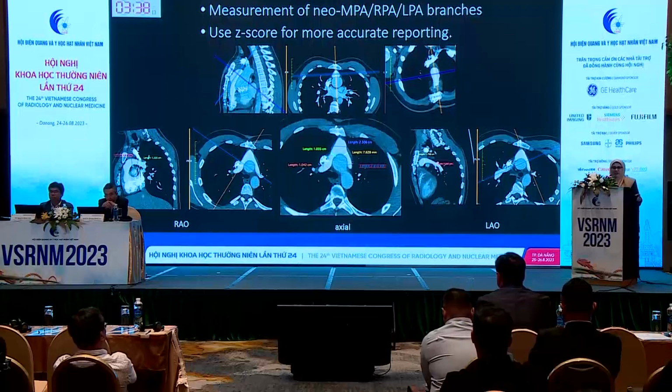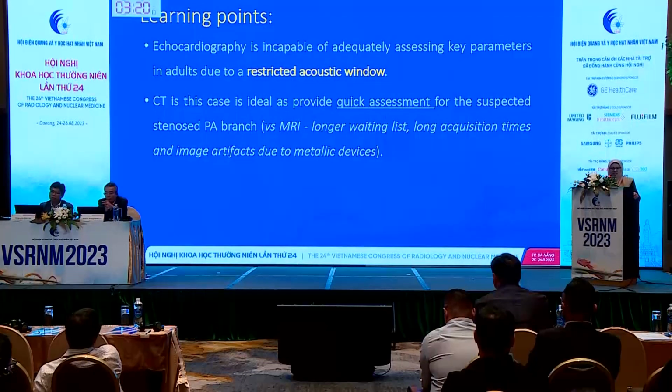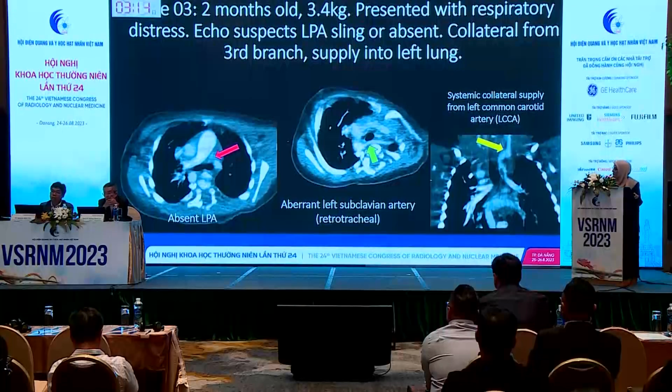So my advice is please use a Z-score, and there are multiple websites you can use for reference. I use parameterz.com, and it's easily available, although it is based on echo. So the learning point here is that echo in this situation cannot adequately assess the LPA stenosis, particularly in cases like this, because of a restricted acoustic window. And CT is definitely the way to go for this patient, and always do an MPR.